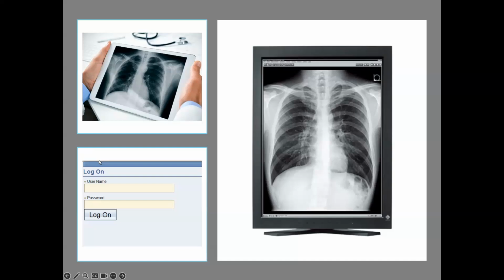We now can invert, we can change the density, we can use our mouse and scroll up or down to darken or lighten the image. We can even put it in particular views. Now, today's not about CT or MRI, but we know we have the lung window now that we can use, among other options.